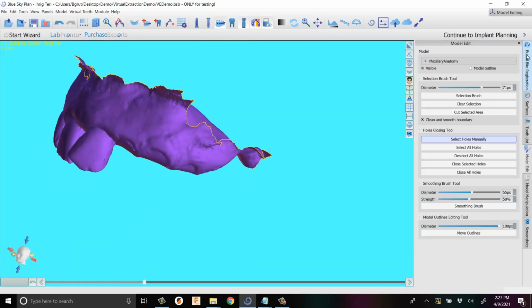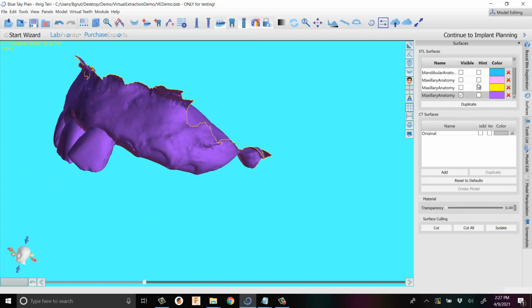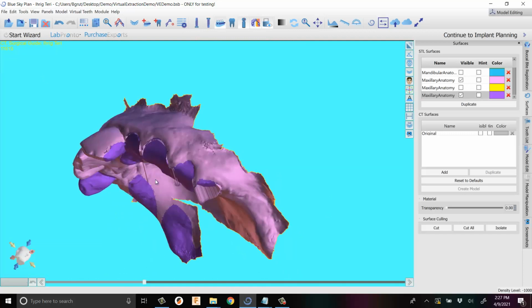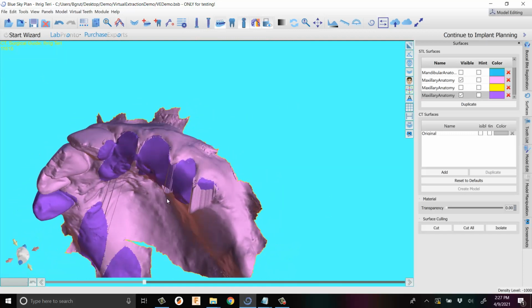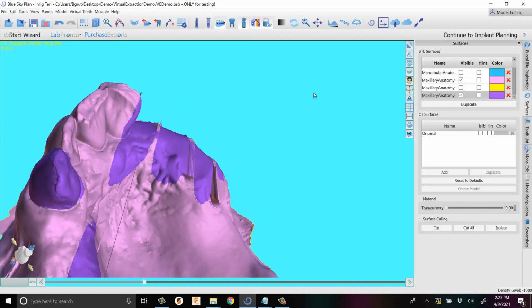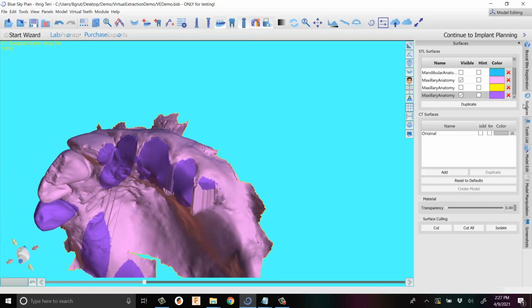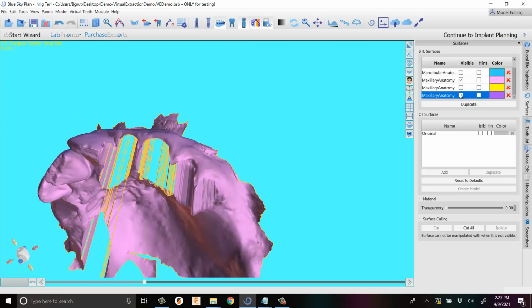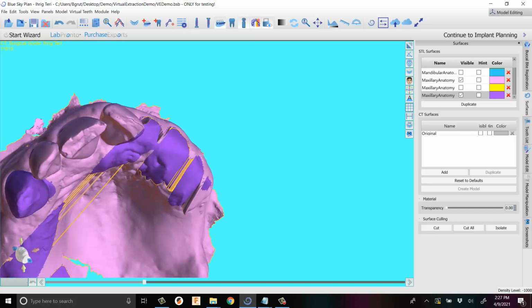And let's compare this to the one we did before, which I don't think anyone really needs to see the comparison, but pretty terrible by comparison, right? I mean, this purple one is so much better. It's not perfect, but it is a gazillion times better. I didn't even notice how much I cut off of the distal of the central in that last one. I knew I'd done it a little bit, but not that much. So you can see that there's obviously a preferred technique here.